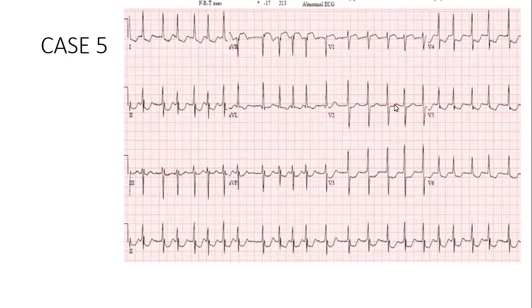So what is that? Atrial fibrillation. Why don't you see the T wave on that? Usually with an atrial fibrillation, you don't see a P wave. And sometimes, especially this is a fast AF. So with a fast AF, be careful not to think the T is the P. So this is an atrial fibrillation.